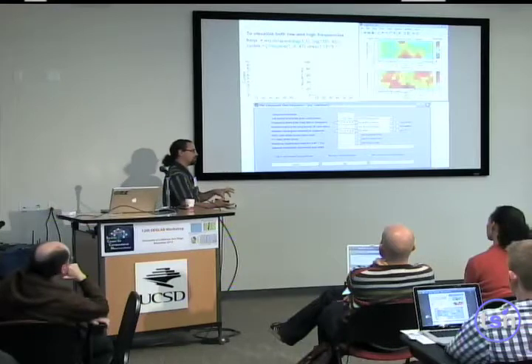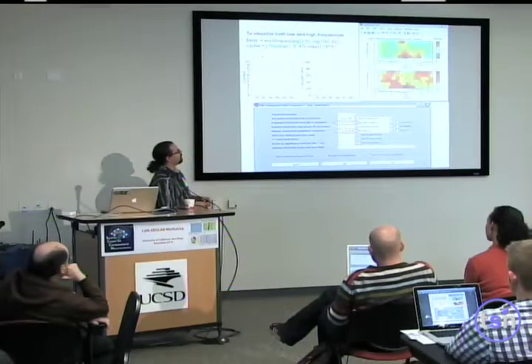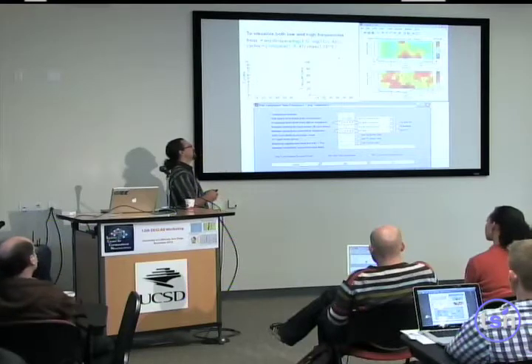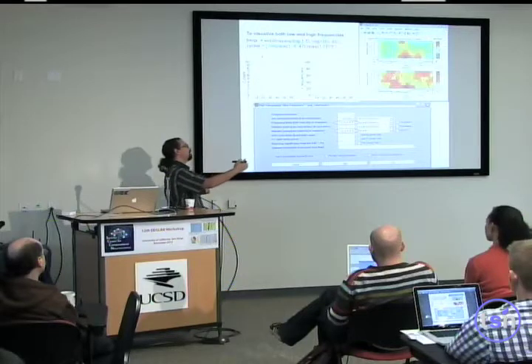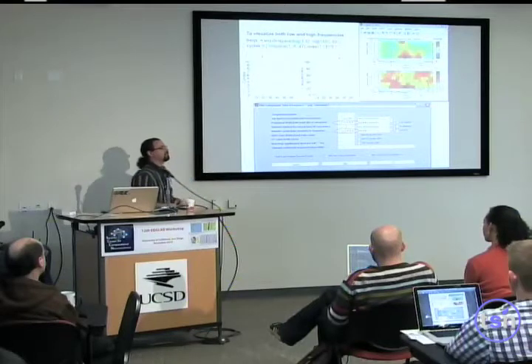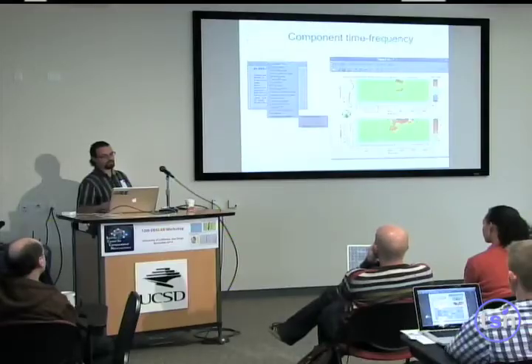So I can study low frequencies because I have some time resolution. For instance, for theta, I only have 2 cycles, so I can see some slow oscillation. If I was taking 10 cycles for theta, again, I would need very, very long windows. And at high frequency, I don't need that. So on the single plot, I'm going to be able to look at theta and also high frequency. If I wasn't doing this cap right here, it would keep on increasing at different frequencies. So I would look at 30 hertz, I might have 8 cycles, but at 60 hertz, I'm still going to have 20 cycles. And then it might be harder to interpret. That's my personal preference. You can do whatever you want, of course.